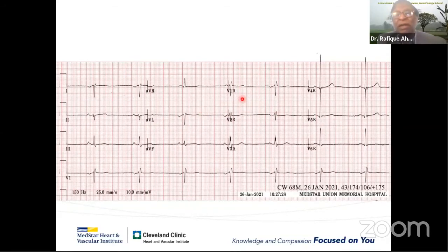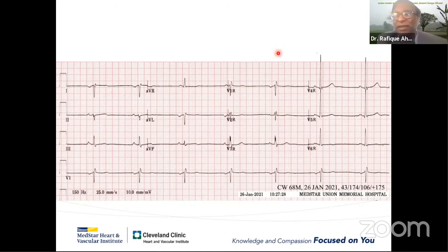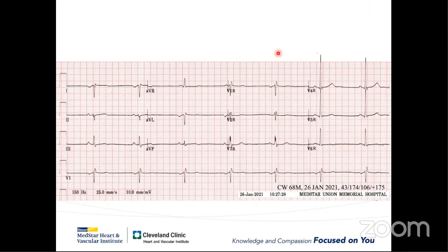Here I have put the marking that this is a V1 right-sided lead. So that is marked as a right-sided lead. Can I say something with this ECG? I'm Dr. Naruma, sir, from pediatric cardiology. Yes, sir. In lead 1 the P is negative and in aVR the P is positive. So yes, that is situs inversus, and in the chest leads there is progression of the R wave. So there is levocardia. So it can be a complex one, situs inversus with levocardia.